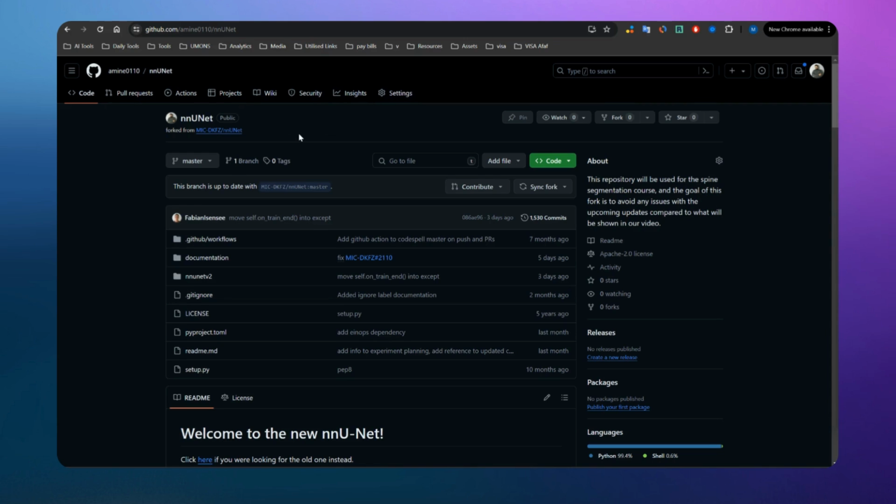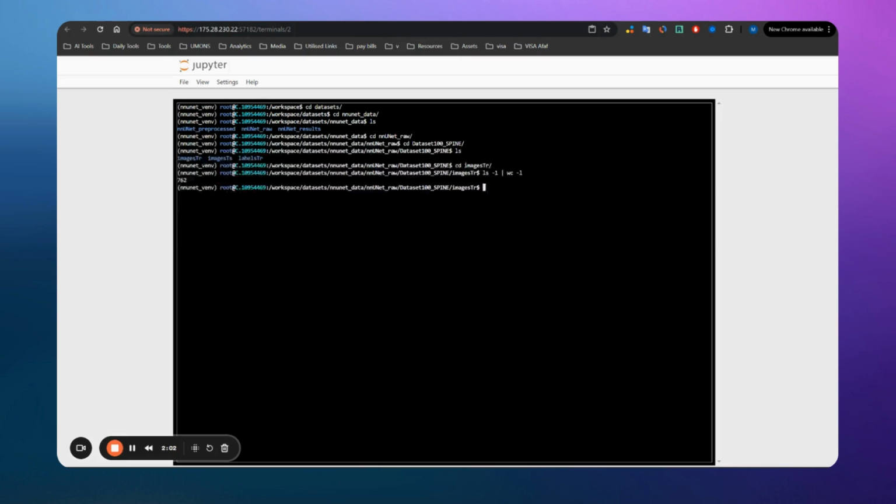Okay, so as I said, we'll install it. The first thing that we'll do is clone the repository, then install it. I already have the commands to do that. If you remember, we saw this on our first day when we discussed the course structure, or the course steps. So let me just go back to the workspace. Okay, so now we are in the workspace.